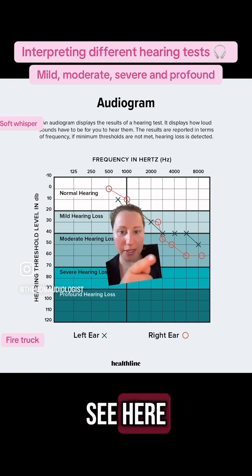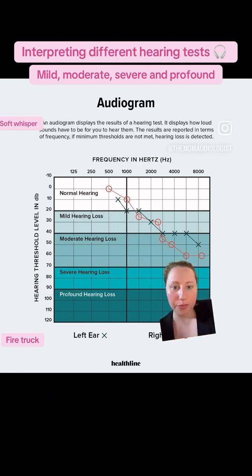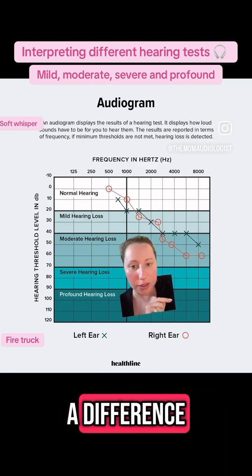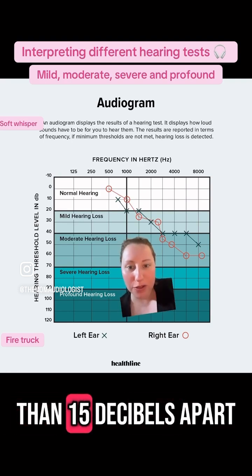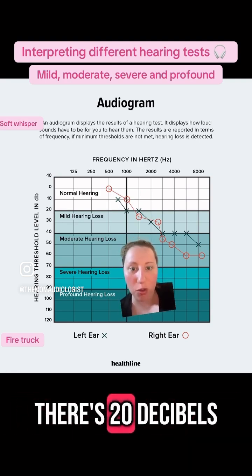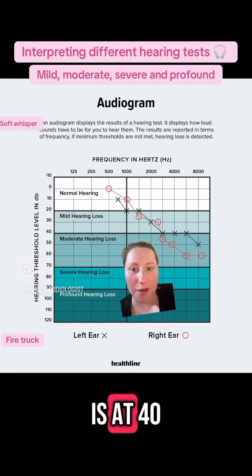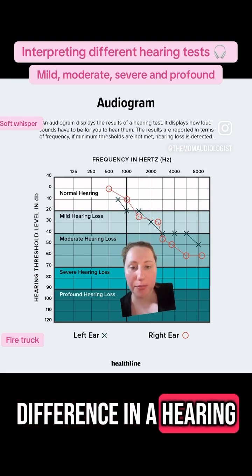Now you can see there is a little difference between the two ears right here, but we call a difference clinically significant if it's more than 15 decibels apart. There's 20 decibels between the ears: the left ear is at 40, the right ear is at 60. So that is a clinically significant difference in the hearing.